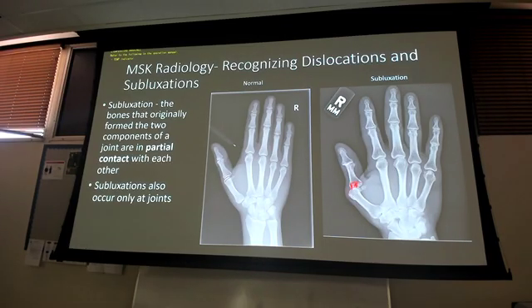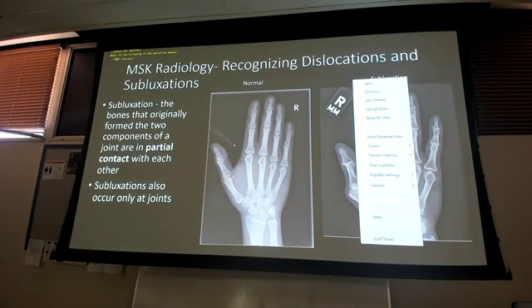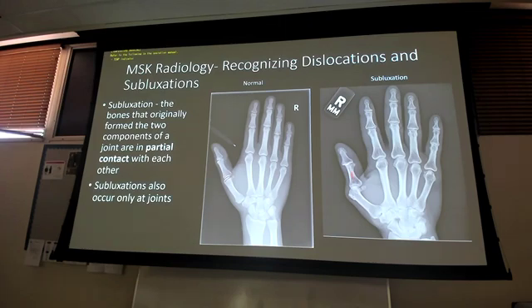Still naming it for the distal fragment, and this is where you have to think about this. When we're talking distal, we're talking anatomic position. So which is the distal fragment? Let's label it here, 1 and 2. What's the distal fragment? 1 is the distal fragment. It's not always the one that's inferior on the x-ray, it's what's the distal fragment per anatomy. And now which way are we going to name this then?